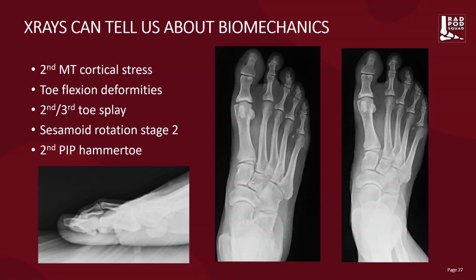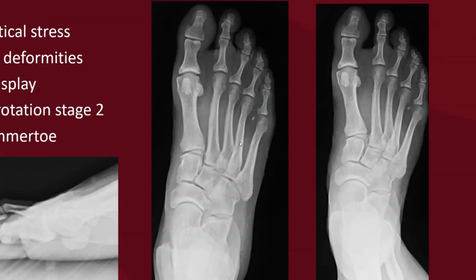Taking a look at forefoot biomechanics through reading of our x-rays, after we've gone through our usual interrogation of reading a normal x-ray, which in the forefoot will include not only looking for fractures, any kind of transverse infraction, of course, looking for AVN, looking for Freiberg's infraction, understanding the alignment that the second metatarsal base needs to articulate with the middle cuneiform, that we don't have any Lisfranc malalignment. We begin to further look at subtle clues of the biomechanics. And in this case, again, we can see here that the thickening of the cortex may indicate an increased biomechanical load or even a prior healed stress fracture.